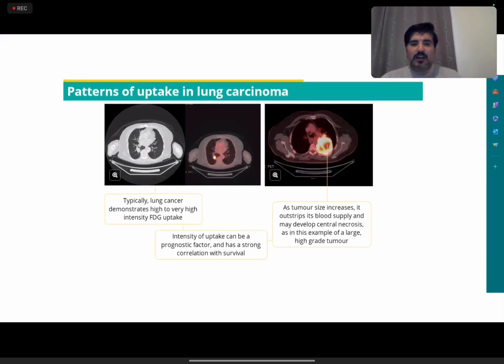Okay, so you should know about these things before approaching the PET CT scan. This is how PET helps you in lung cancer. It might show an avid uptake. We document the SUV value as well. What is the SUV max of that lesion? If it is 5 or more, it is more diagnostic of a malignancy. Still, it can be an infection as well. So I repeat again and again, PET is a sensitive investigation, but it's not a specific investigation.